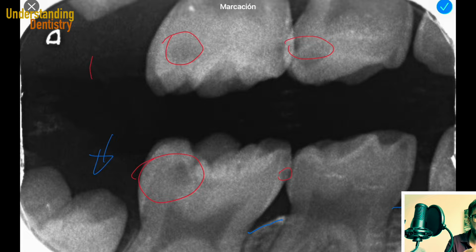Also an unerupted molar here, but then maybe we need periapical radiographs or even a CBCT in case of third molars. So just to let you guys know that we have other options as well. But the mistake that I'm talking about here on this Bitewing radiograph is that here we can see the alveolar crests, okay, but we cannot see the alveolar crests of the upper arch, all right, because it's not centralized vertically on the patient correctly, okay?